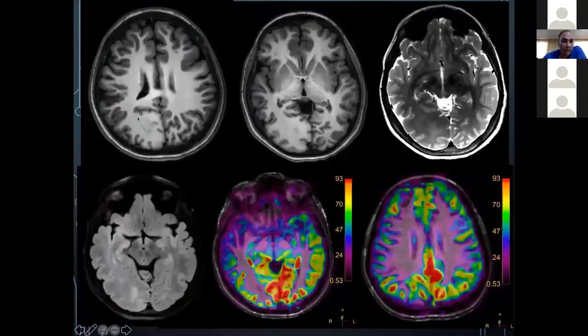In this particular case, you can see not only that there's some sort of fullness in the right side occipital region, and a mass effect kind of thing is seen. And if you see carefully, this whole thing looks slightly swollen. Look at the cortex. Cortex is not looking normal intensity here. Cortex looks slightly brighter on T1 weighted images, and there are some islands of sparing in between. You can very clearly see, and the 3D T2 weighted images also corroborate our findings.